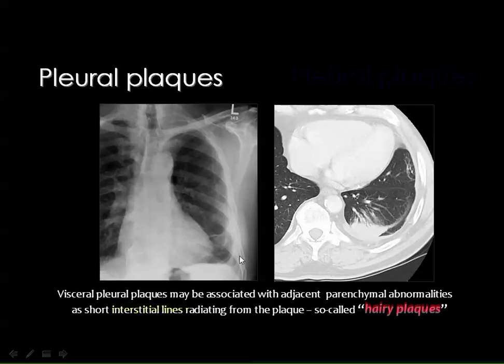And if you look here in this X-ray, you see costal pleural thickening, and whenever the pleural thickening is continuous, this is known as thickening. When it is discontinuous, we call these plaques. Then pleural thickening along the costal pleura with obliteration of the costophrenic angle and some linear atelectatic bands related to the surface of the pleura.